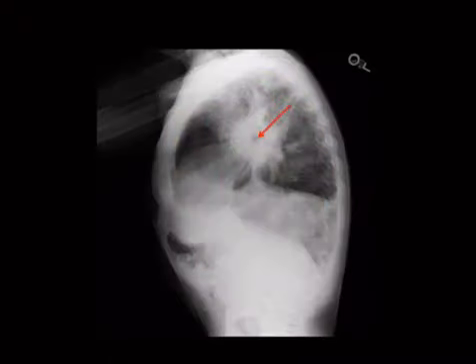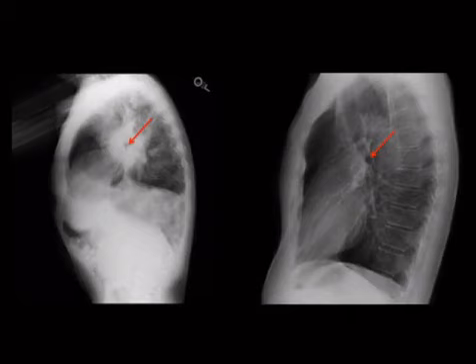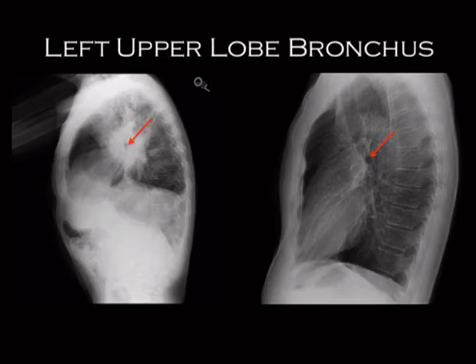See, here's a follow-up question. What's that thing? What's the hole in the middle of the donut? It's the same thing as you see here on a normal lateral chest radiograph. This is the so-called black hole, and it's the left upper lobe bronchus en face. The left pulmonary artery is going to go over top of that thing, and then immediately anterior to that is going to be your right pulmonary artery. So, right, left.